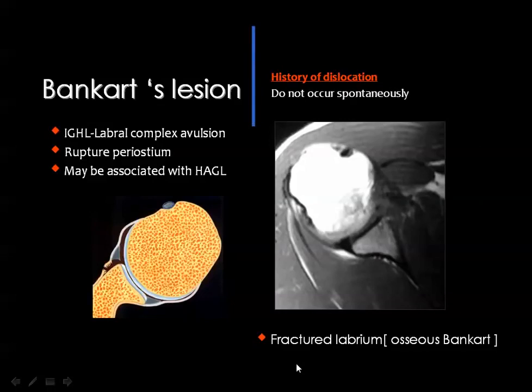The first lesion which affects the glenoid labrum, and which is commonly seen in clinical practice, is the Bankart lesion. Bankart lesion means injury of the anterior glenoid labrum. Here you can see the posterior glenoid labrum, while the anterior one is not identified. Its site is occupied by granulation tissue, hemorrhage, and contusion secondary to trauma.